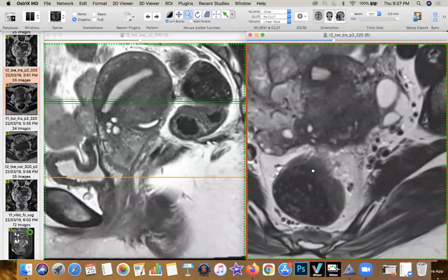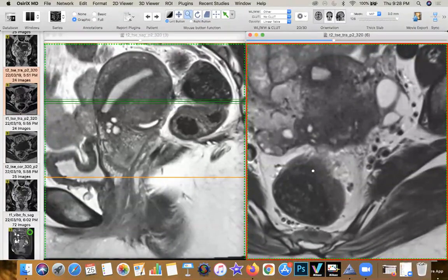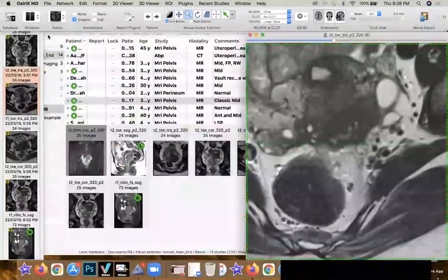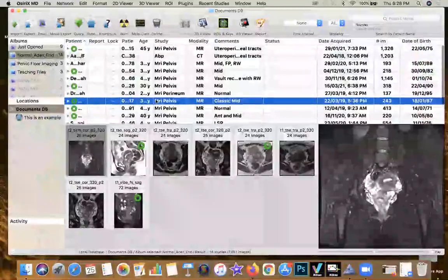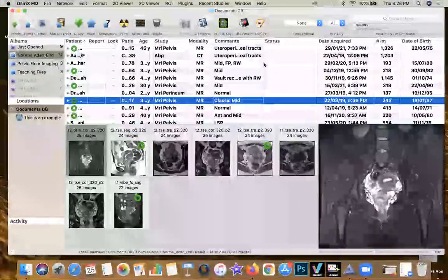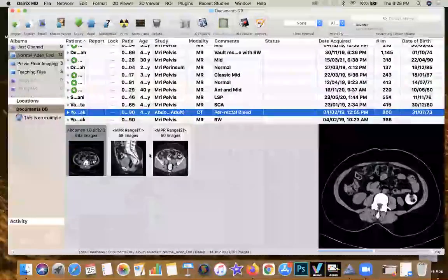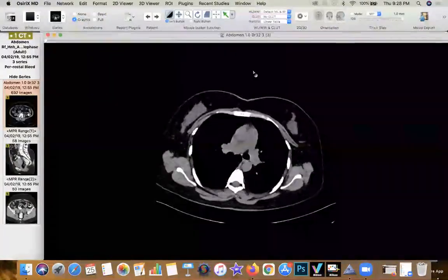So the first case, what I tried to show you was to enunciate the basic changes in the contouring, the morphology of how the lesion looks on MR, and what else we tend to get with the gamut of pathologies going on. So what I'll do now is, rather than showing you some cases, I'll show you a couple of presentations of the disease in a clinical form, and then we can take it ahead in terms of how this usually tends to present in clinical practice. So let's see this case out here.